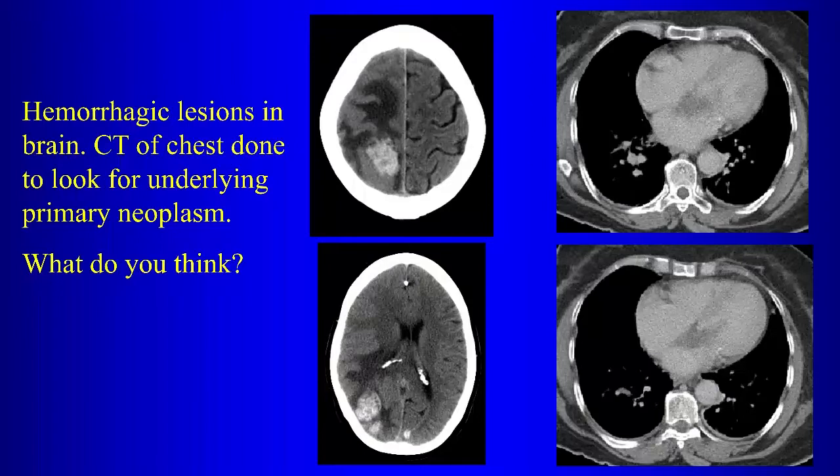In radiology, we're not going to send them to echo, not yet. MR. So we want to do MR. What sequence, what view would you like to see? Four-chamber view. What sequence would you like to see? You'd like to see a bright blood imaging sequence.